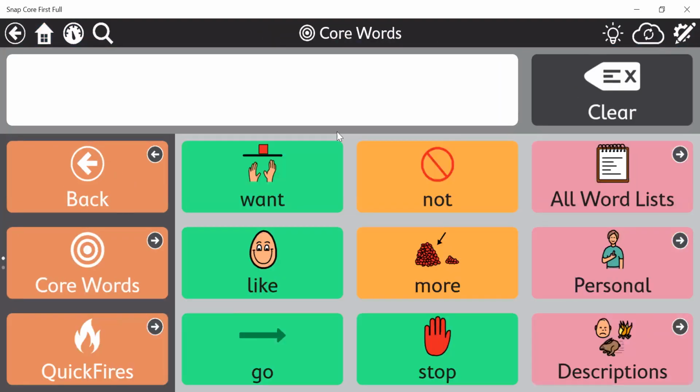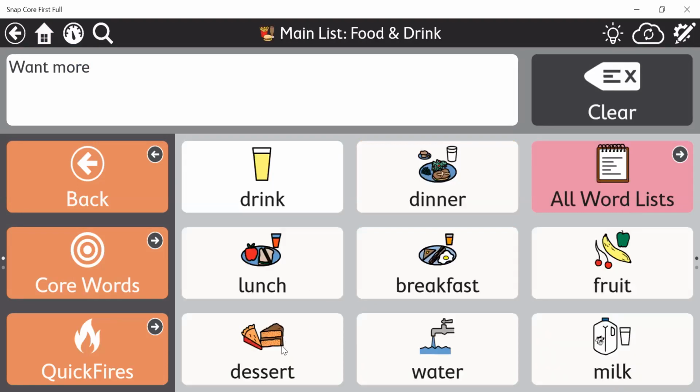So once we start growing this grid size to at least a 3x3 level, you'll notice that we now have a toolbar, we have a message window. So once they've started excelling at that supported navigation, we can move them out to here, and this will be the main layout from here on out. They can start combining words, even with their fringe vocabulary, to build their own sentences.